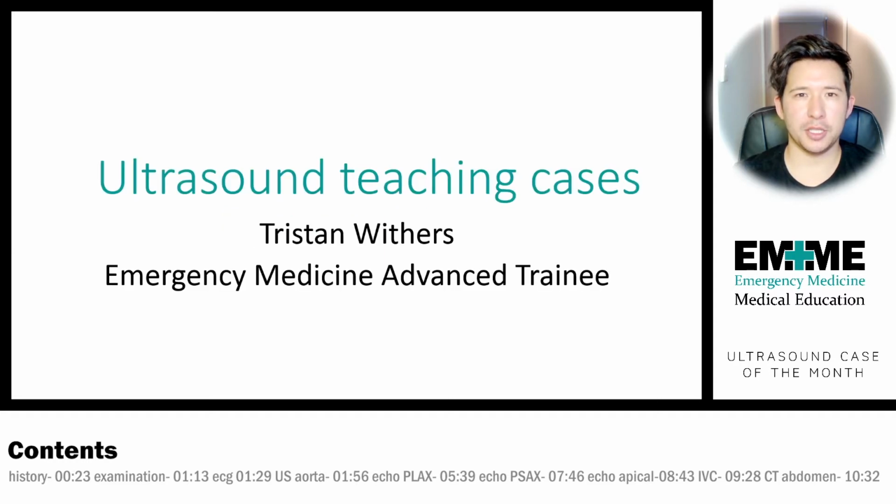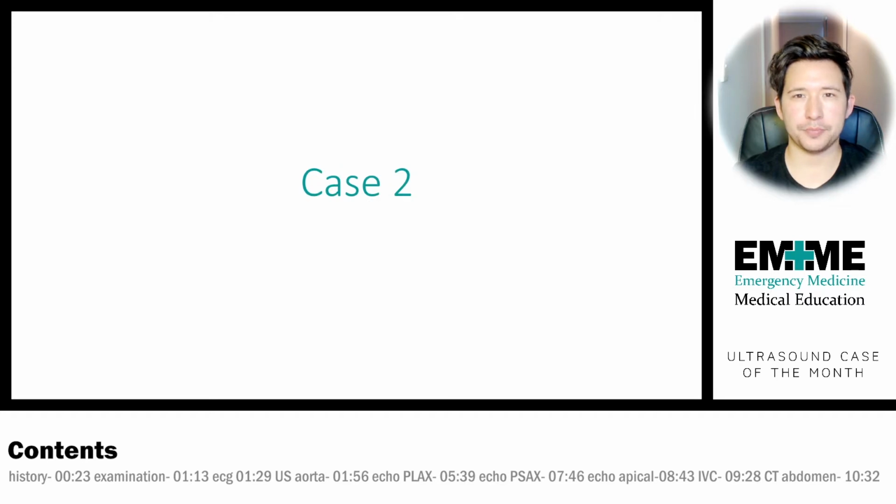My name is Tristan Withers and today we're going to be talking you through an emergency medicine case where ultrasound was used, and I'm going to talk you through the pictures and how to interpret them.